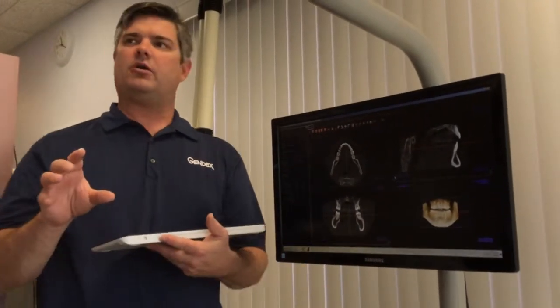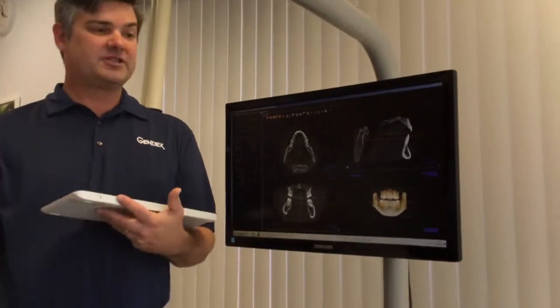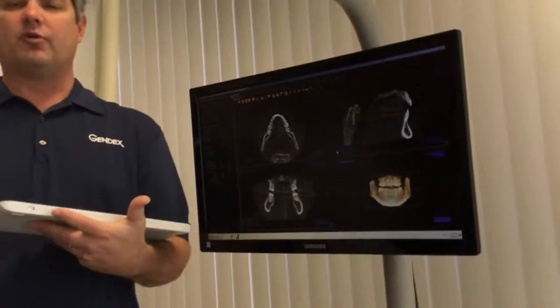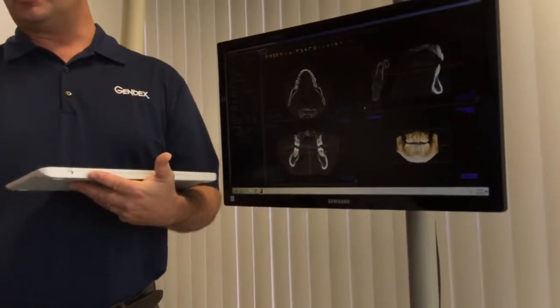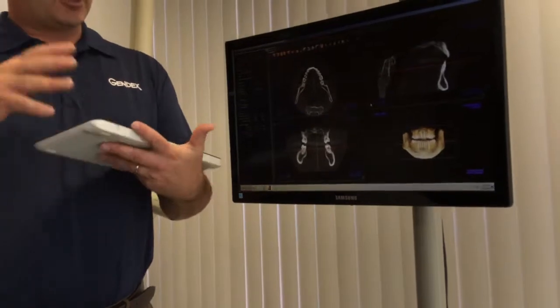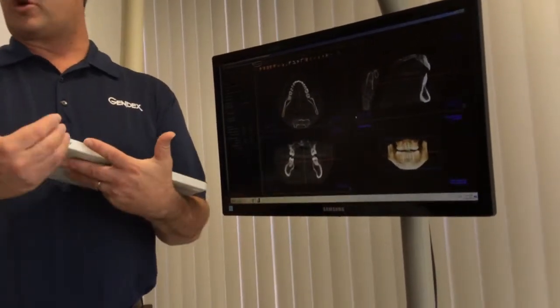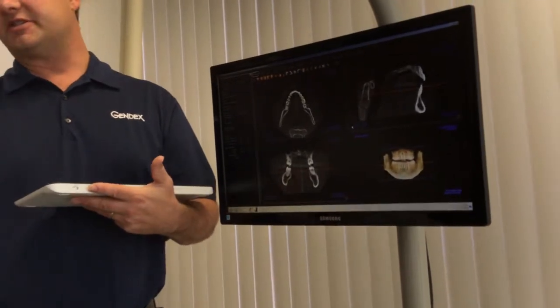And DEXIS only holds the raw DICOM data. So that was the original scan. That's all DEXIS does is capture, and then it's a historical lookup for you. So if you lose everything, the good thing is DEXIS holds your whole database there as well. So you always have the original scans in there, which is good. Now, if you're doing a case and you've done all sorts of work on it, that's where that shared folder that we just opened up does all the working and your daily progress and stuff.